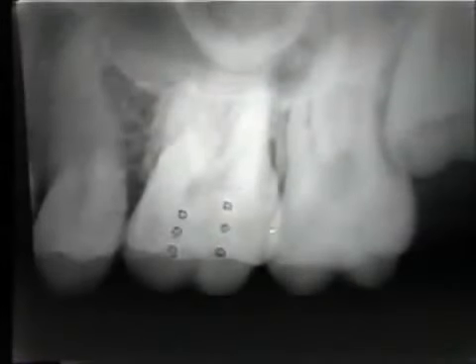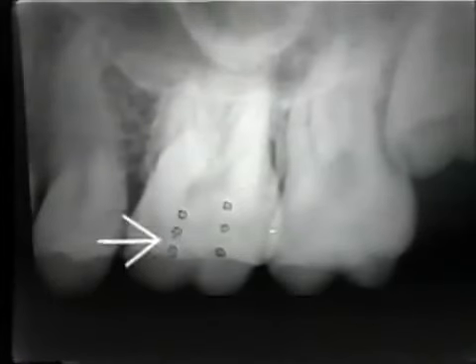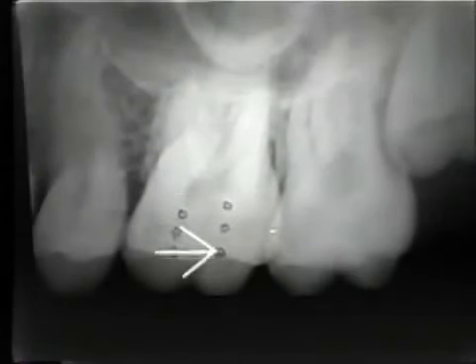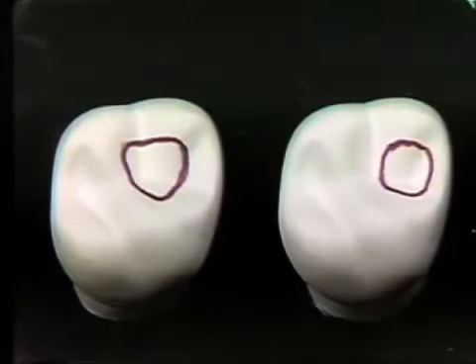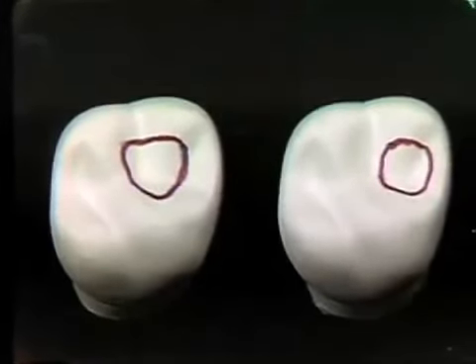Test yourself on this variation. Study this radiograph of the maxillary molar. Note the shape and mesiodistal size of the pulp and where it transfers to the surface of the tooth. In this case, the pulp is slightly mesial of the center. Now study the crown shape of these models and try and decide which should be the outline form of the pulp. You should have said the one on the left. The area bounded by the mesiolingual, mesial buccal, and distal buccal cusp forms a triangular area with the pulp very much in the center of that area.